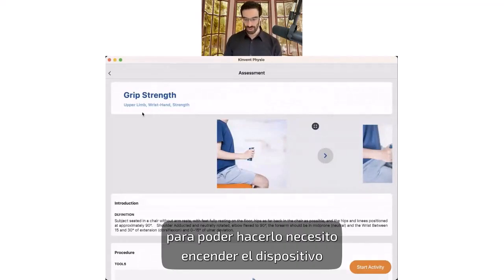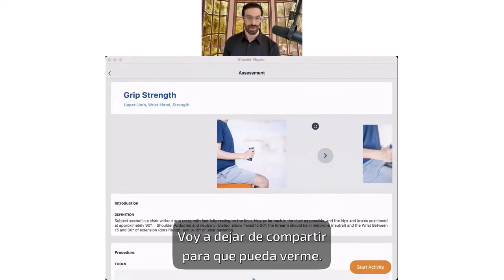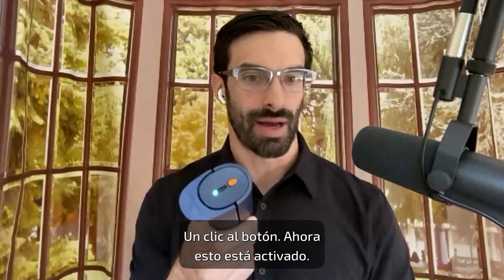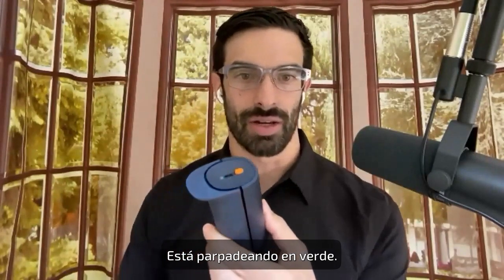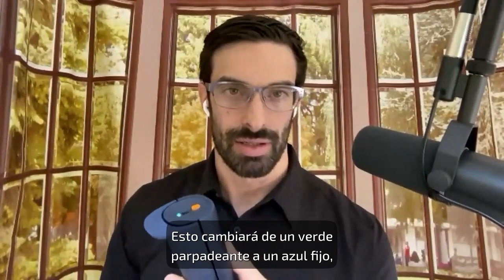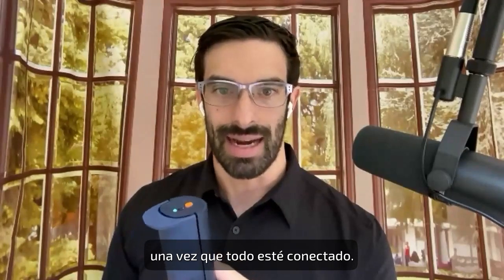Now, in order to do so, I need to turn on the device. And I'll show you right now this process. I'm going to stop sharing so you can see me. We have the device, single click button. Now this is turned on. It is blinking green. Now this will change from a blinking green to a solid blue once everything is connected.